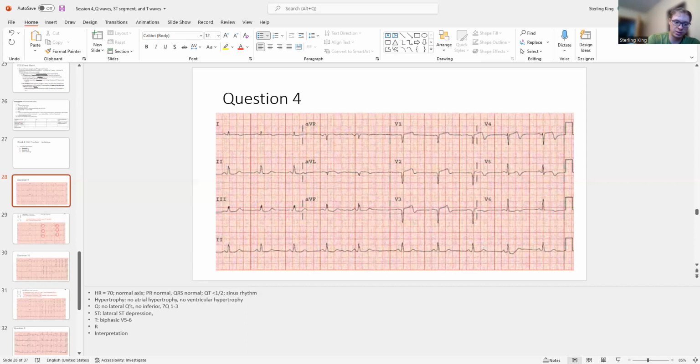So let's do the inferior. We already did the Q waves. Usually, if you're going to screen the ECG, you have to detect both Q waves and the ST segment, so it doesn't help to cut it out. It looks pretty similar, perhaps a little bit lower, but not by much. About 2 boxes below that big line.